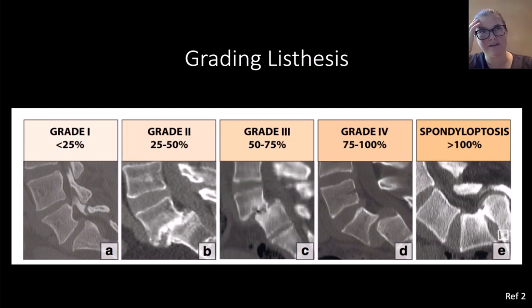Occasionally on the MRI, it can be a little bit harder to see the pars interarticularis defects, but just remember you have the patient's folder to go back and look at. So go back and look. If you've got a previous radiograph or CT, go back and confirm that yes, there's pars defects, or yes, it's probably just from facet degenerative change.